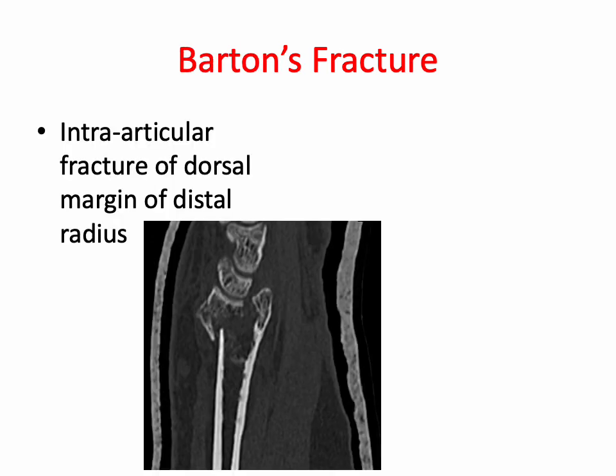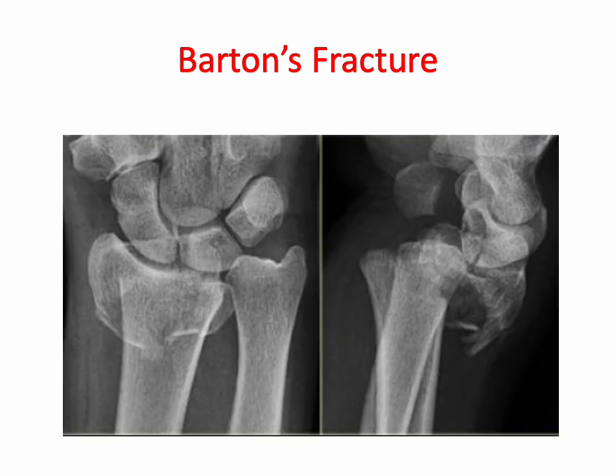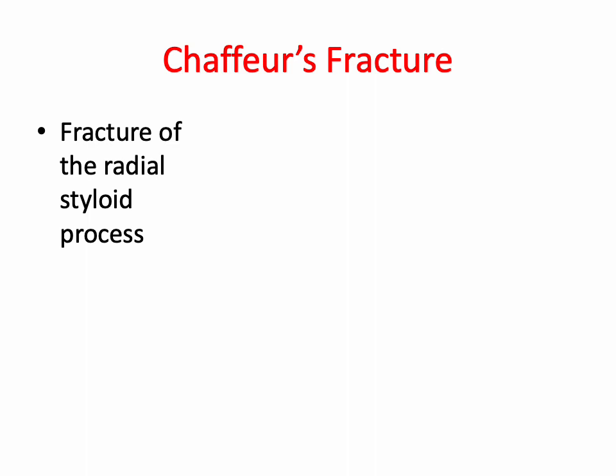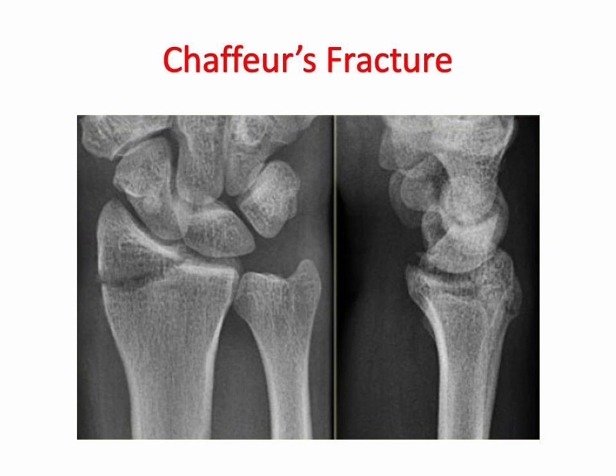A Barton's fracture is an intra-articular fracture of the dorsal margin of the distal radius, which you can see here. And a Chauffeur's fracture is a fracture of the styloid process of the radius. Again, an intra-articular fracture of the styloid process of the radius.